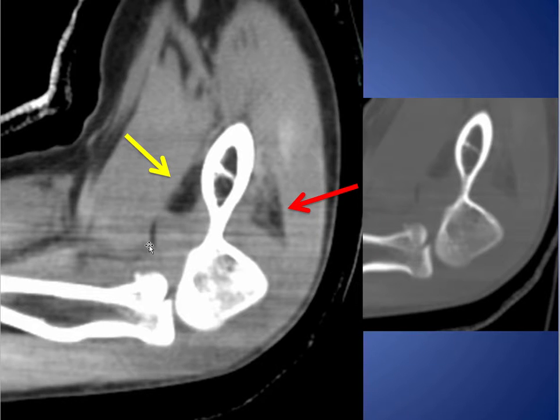So as an example, this is a sagittal CT scan just showing these hypodense fat pads. Elevated here is the anterior fat pad, here's the posterior fat pad. You can see there's an underlying joint effusion that's pushing and displacing that posterior fat pad out of the olecranon fossa where it normally sits. On a lateral radiograph it would be obscured by the surrounding bony contour.